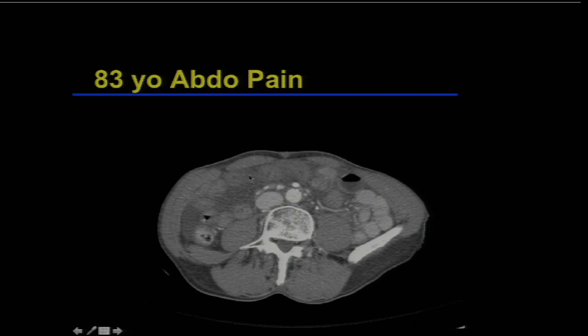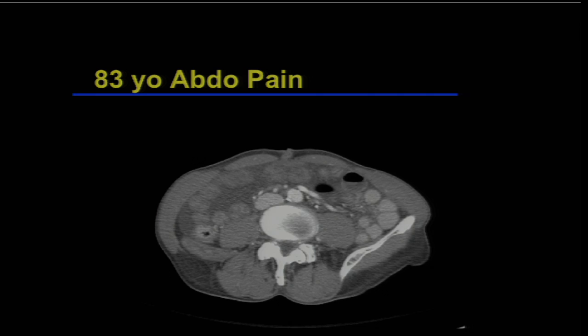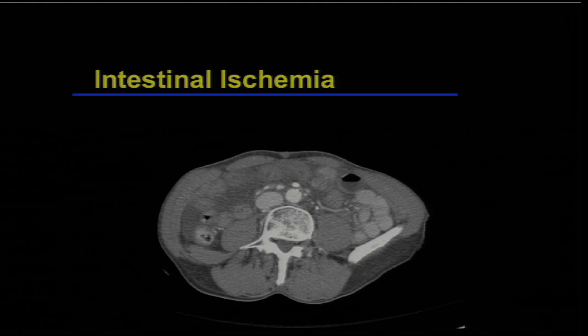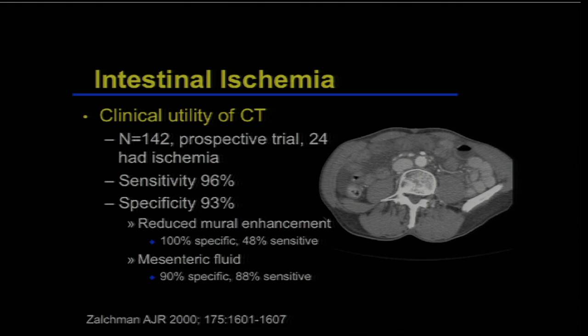There's no pneumatosis intestinalis, but the bowel wall seems to smudge into the background where there's edema in the mesenteric root and free fluid. This patient we sent to the OR, and she had many feet of dead ischemic ileum in her abdomen. So even in the absence of bowel dilatation, no pneumatosis, we can make these diagnoses of bowel ischemia and infarction.